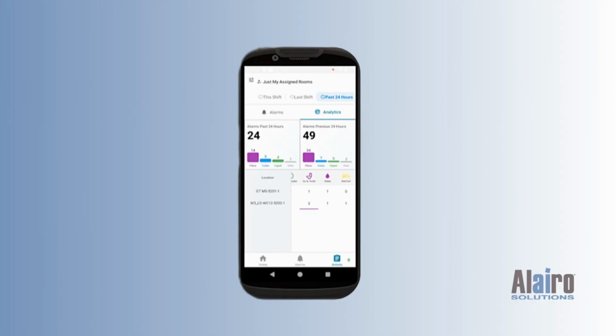If you look at the one on the top that says this shift, you can see that this shift so far we've had 15 calls. 8 were pillow speaker, 3 were codes, 3 were urgent, and 1 was a fall call, which in this instance is a bed alarm. If you look at last shift, you can see that last shift we didn't have any because that was during the middle of the night and I didn't place any calls. Previous shift, we had 23 calls. So yesterday we had 23 calls during the day.